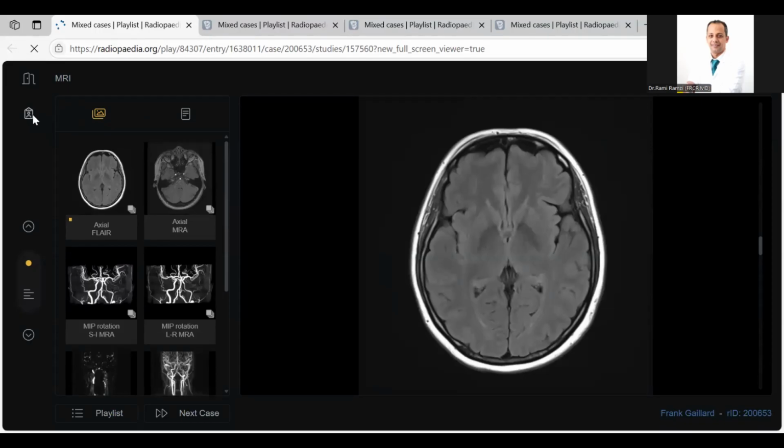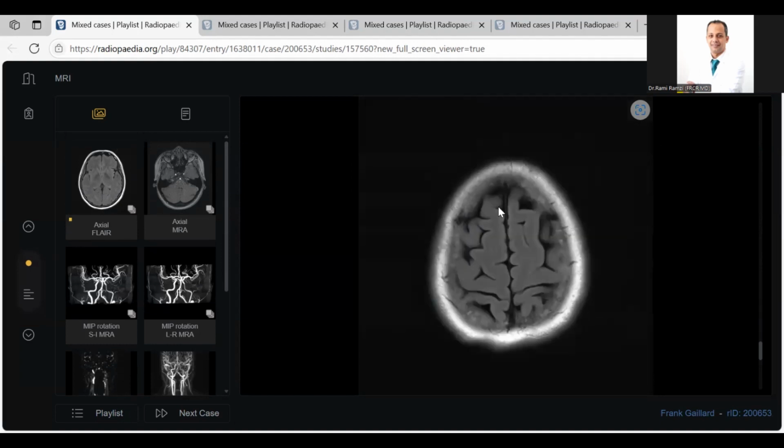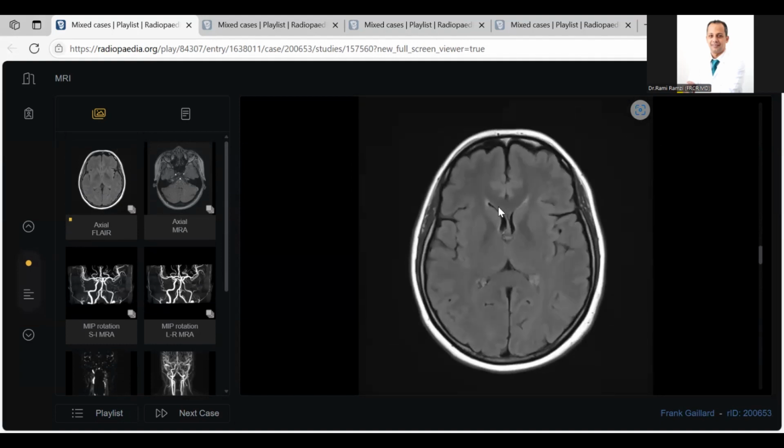Yes. This patient presented with chronic headache, and he is a chronic patient, by the way. Sometimes he has bilateral, unilateral, or contralateral numbness. Okay, so his clinician asked us to do an MRA, and this FLAIR sequence was acquired. Go on.